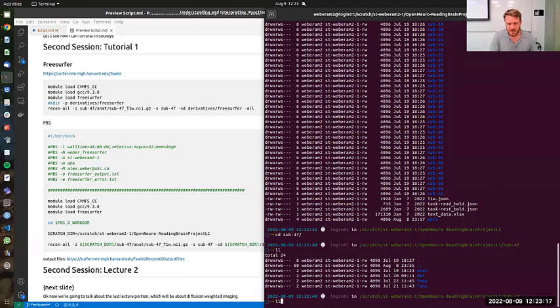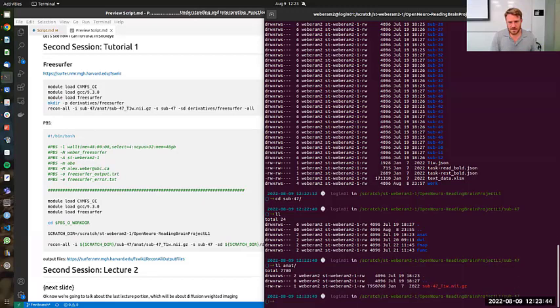So here we see that inside the subject folder there is an anatomy folder, a DWI folder, an FMAP, which is going to be used to correct for susceptibility distortions in EPI T2-star weighted scans, which are both our functional and our diffusion. It has some functional data here, but we're not going to look at that today. Inside the anatomy folder, they just have a NIfTI file for the T1. There should be a JSON file here. They haven't included it, but they have included in the main folder a generic T1 weighted JSON.